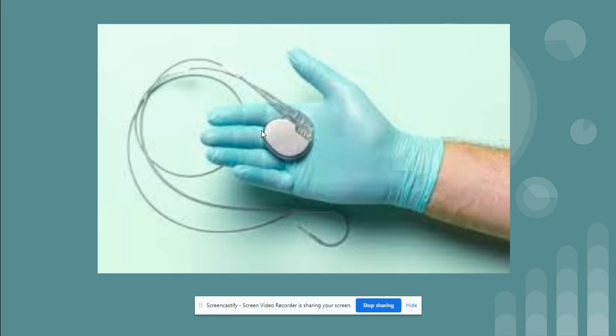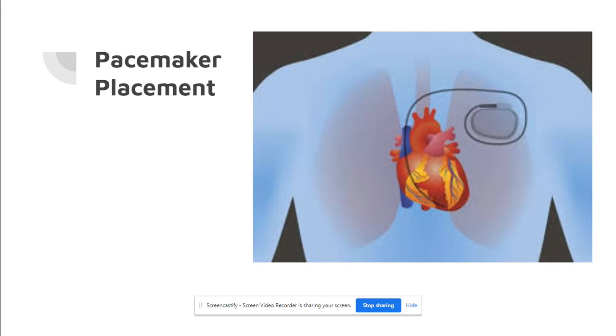This is a pacemaker, obviously in the hand of a healthcare provider, showing you the relative size of a typical pacemaker. This is a pacemaker that is a little bit older, and you're going to start to see pacemakers that are quite a bit smaller, but many people still have these pacemakers in place, and you need to be familiar with those. Pacemaker placement can either be in the left or right of the patient's chest, and a lead wire comes from that and moves all the way into the heart.